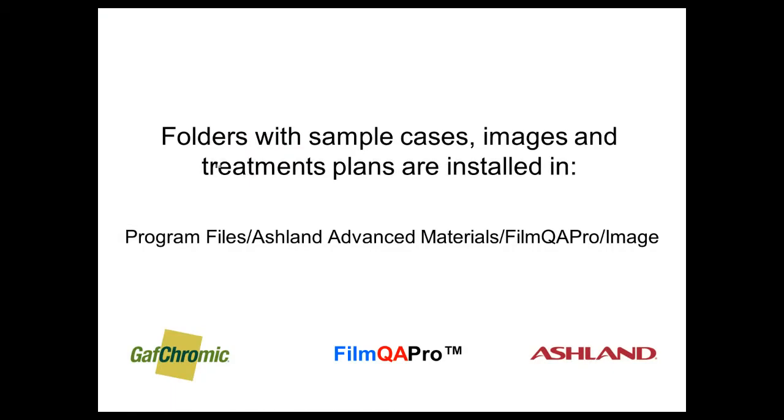In addition to the application, the installation package also contains folders with demonstration files of images of calibration films, dose films, machine QA films, treatment plans, etc. These files are provided so you can work through a case study by yourself, and they are available under Program Files / Ashland Advanced Materials / FilmQAPro / Images.